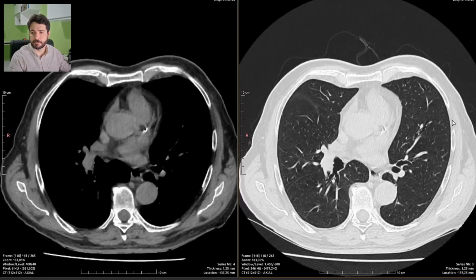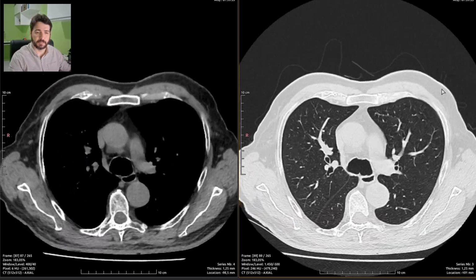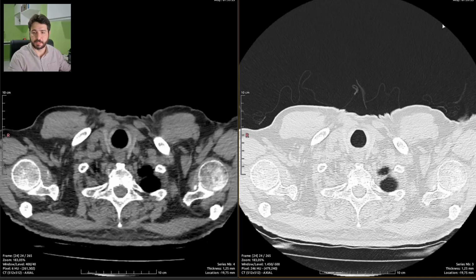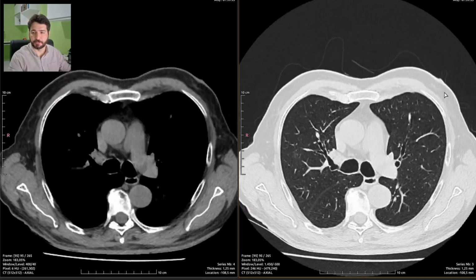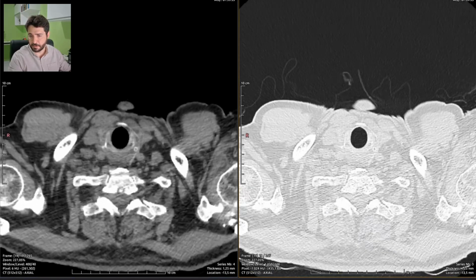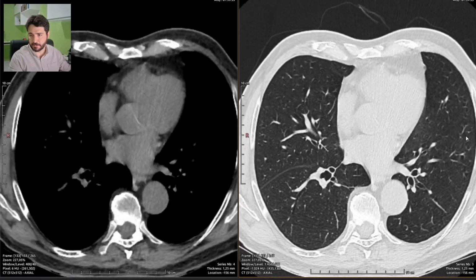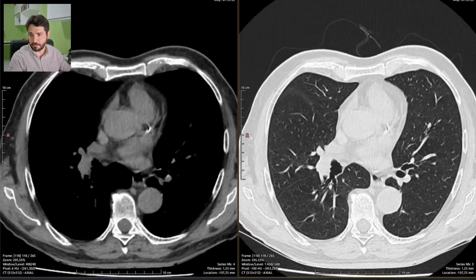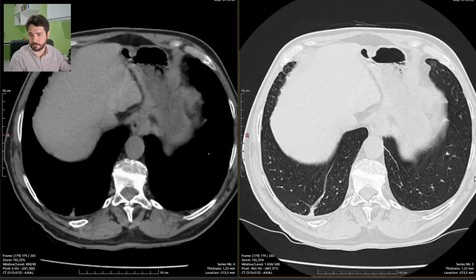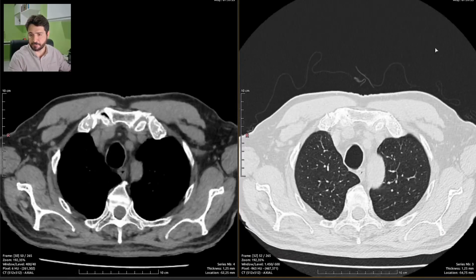So, did you guys see anything? I have seen a few things, nothing major. I don't really think this patient has anything very much wrong with him. I clearly don't see any signs of emphysema nor a highly distorted lung disease, which we would expect from a patient that is a heavy smoker.